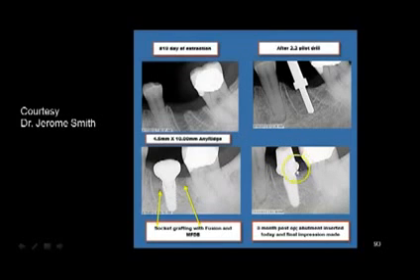I believe this is a solid abutment, or maybe an easy post abutment. Either way, they're shaped the exact same way, but bottom line is, he put a molar type restoration on this 4.5 implant. Because notice again, this is your big size tooth here, so this is your larger size abutment. Your abutments do come in 4, 5, 6, and 7 millimeter profile diameters, so you can very easily match whatever size tooth you have. Your molars would be more so for your 7 millimeter abutments, and even sometimes your 6 millimeter abutments if it's a smaller type molar.